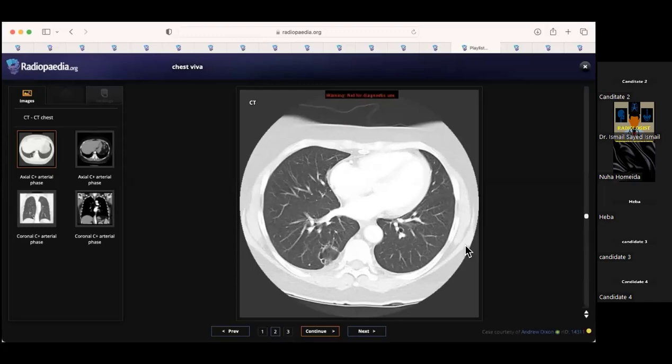Okay, so this patient is quite young with recurrent lung abscesses. Does it make you think of anything? What would you look for if she's that young with a repeated history of lung abscess? Is there anything specific that you would actively look for? Perhaps why is she more prone to these lung abscesses? Yes, it could be due to a history of foreign body. Okay, there is no history of foreign body, so you'll tell the examiner that I'll look at the trachea. It doesn't look like there is any foreign body.